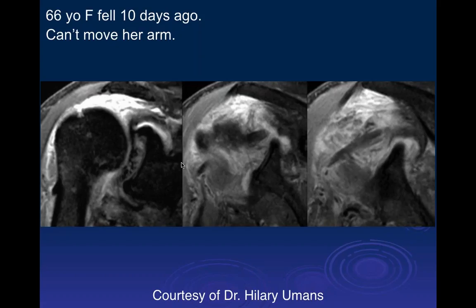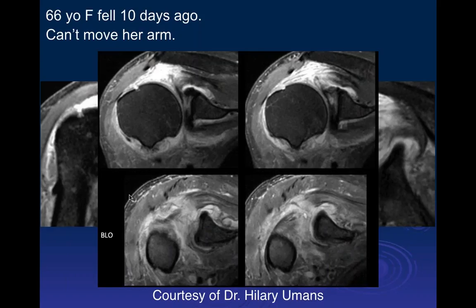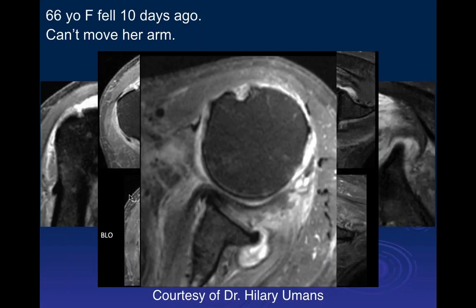And I think we're far, I mean, we're on this coronal, we're probably far anterior on those two images there. But let's see what else. Okay, more coronal images. So again, it looks like severe synovitis. Oh, so on this image here, the axial image, it looks like anterior subluxation of the humeral head, and I don't see the biceps tendon within the bicipital groove.